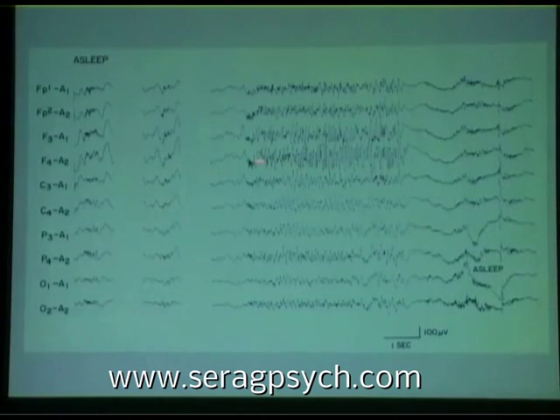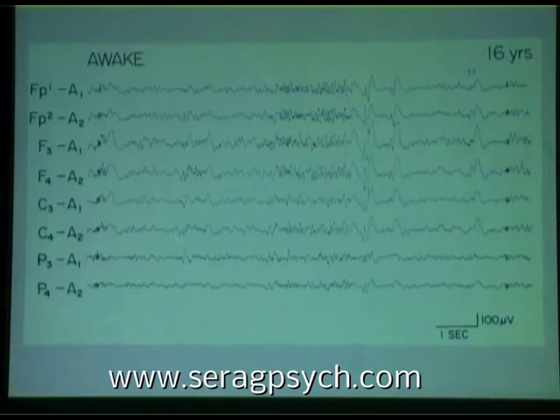And this also, same idea. When you see that, you could have difficulty controlling the seizures. Next, please. And the same thing there. You see it again. Going from an awake patient this time, although that looks like sleep to me, I'm not sure that's correct. That looks like spindles and then some V waves. But anyway, at this stage, right from here to here, you can see sequential polyspikes, and then finally a slow wave which ends it.